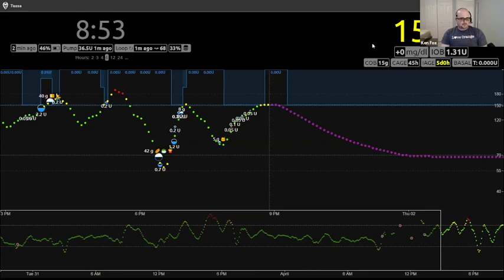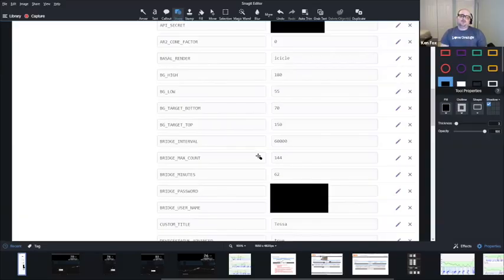So what you can do, it uses a little more cycles on your site, but I have never had it push a limit on Heroku, you can change the bridge interval, BRIDGE_INTERVAL, to this, which is a minute. So this is 60,000 milliseconds. You can change it to how often. You can do it every 30 seconds if you wanted to. But this basically makes Nightscout check for a new reading from Dexcom Share every minute instead of 2.5 minutes. So it's not perfect, but it's a little bit better.